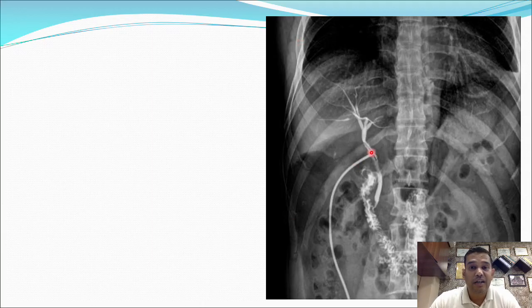Now which body part? I am able to appreciate the lower part of the rib. This is the dome I could appreciate. So most probably this is an X-ray of the abdomen. Next, AP view or a PA view? This is probably an AP view.